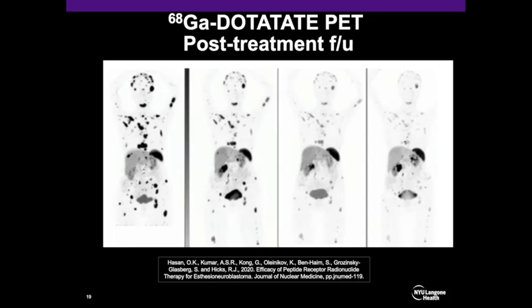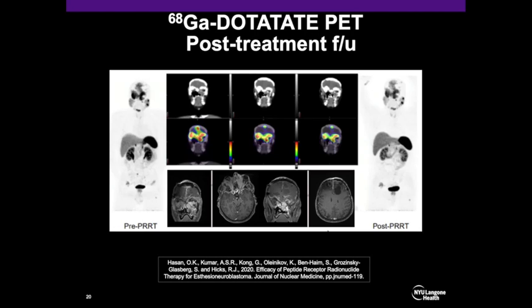And the dotatate PET provides a full spectrum of disease response follow-up. On 4 different time point images, I think you can appreciate the decreased number of lesions and the decreased number of radiotracer uptake and decreased intensity of the radiotracer uptake, which is clearly demonstrating favorable treatment response.